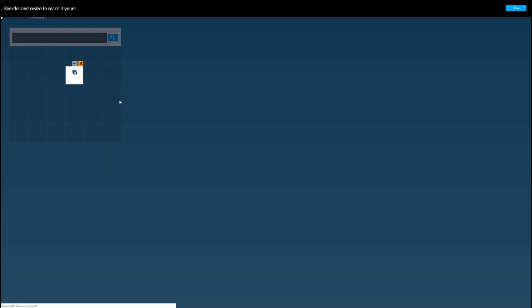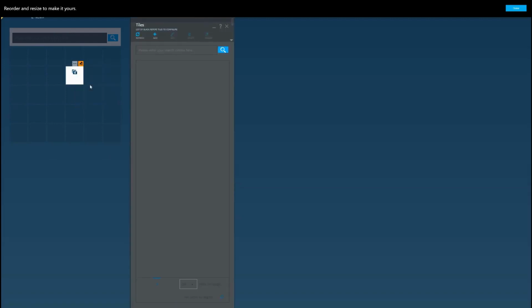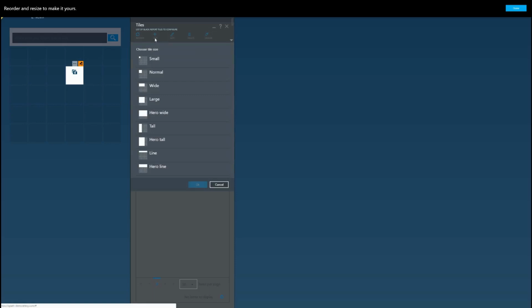Set as Startup will enable the auto launch of the view when user logs in the application. Available design tools offer more options for advanced tile customization to set up data visualizers directly on the desktop tiles.